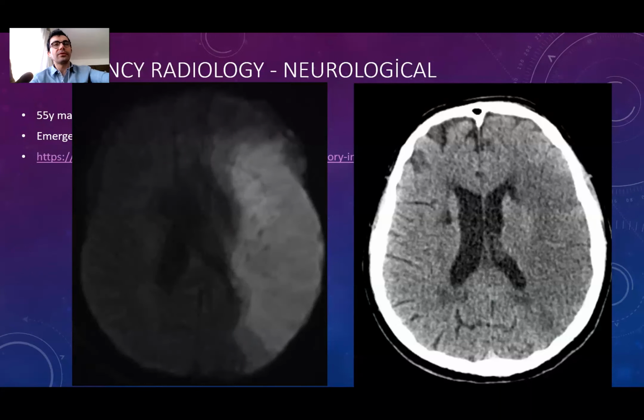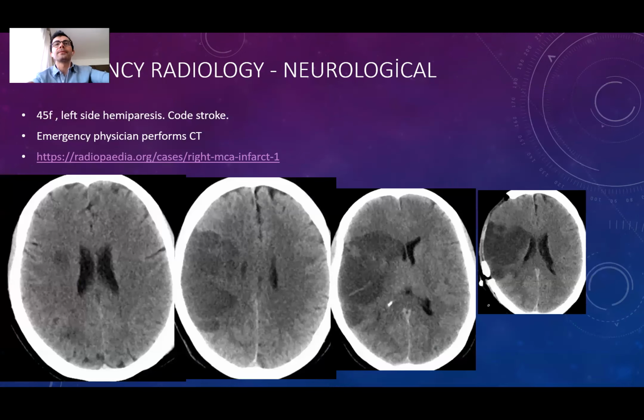Also, if it didn't belong to a territory, it would maybe be a hemorrhagic stroke or ischemic stroke. Because there is no hemorrhagic stroke and there were ischemic areas, it was an ischemic stroke. And now, because it belonged to a territory, I knew that it was coming from the left middle cerebral artery. I'm not going to ask you the territorial facts. It will be a little bit too much for you at this stage, I think.